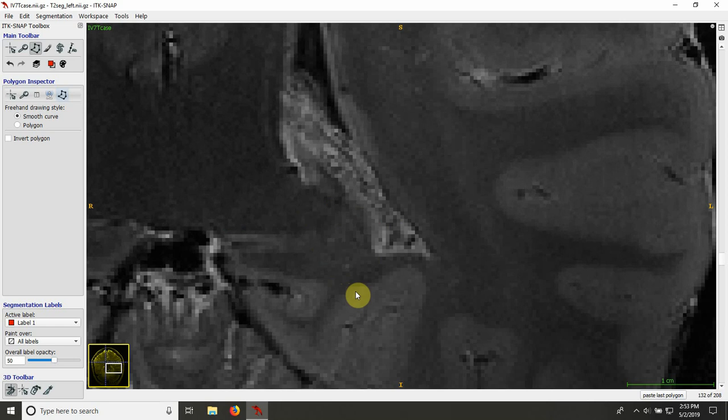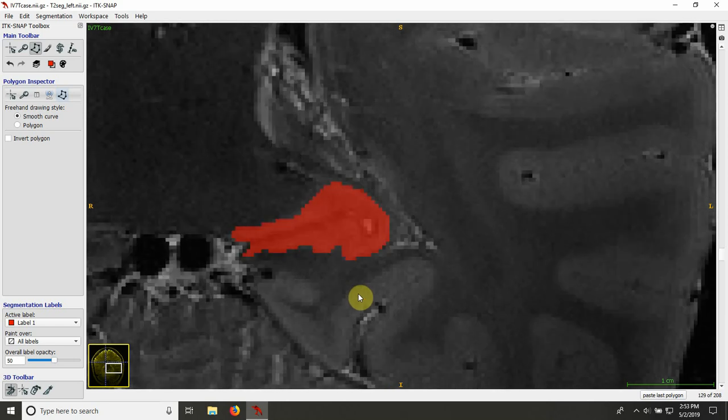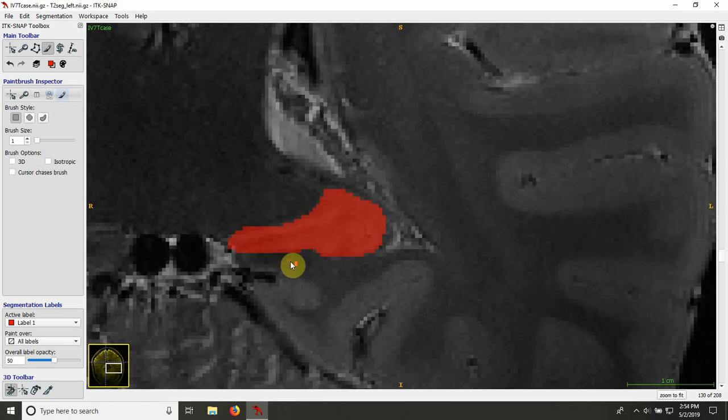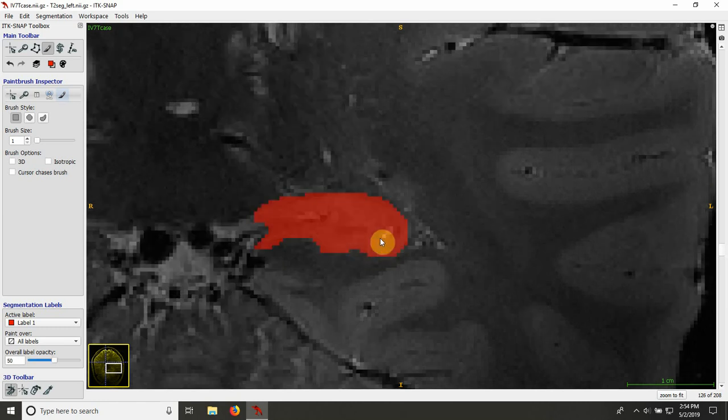So as I already mentioned, normally what I would do is then go through each slice and see if I missed some gray matter voxels, those are the lighter voxels surrounding the outline, or see if I oversegmented some voxels, for example, if a voxel looks darker. And it generally helps to use the S. With the S I can turn on and off the segmentation, so you can check if your segmentation looks okay.